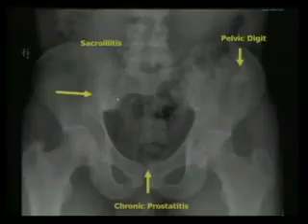Trauma, that makes sense. You had trauma here, you're gonna get degenerative changes, sacroiliitis. Gout, infection. The bilateral symmetric are rheumatoid, ankylosing spondylitis, inflammatory bowel disease. Bilateral asymmetric could be rheumatoid, but it's psoriatic and reactive arthritis, formerly Reiter's. And this is a pelvic digit. They wouldn't do anything about this unless it was causing nerve impingement or something like that.